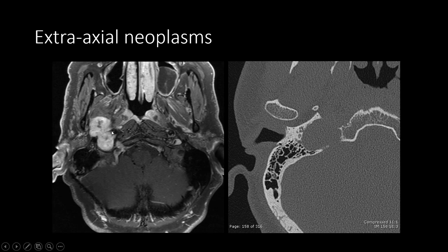This is an example of a jugular foramen schwannoma, of one of the lower cranial nerves, and in this case, we note that the jugular foramen has been smooth and sharply remodeled. So that's a very characteristic appearance of osseous remodeling with a schwannoma, this sharp, smooth remodeling.